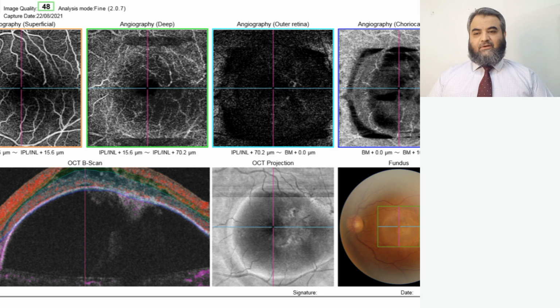Inferiorly, you can see the fundus photograph, and the left side lower is definitely the pigment epithelial detachment and over it fluids in the retina. And the thing I want you to concentrate on, please, is that in pigment epithelial detachment, under it, the space, there is moderate hyperreflectivity. Moderate hyperreflectivity. This is a very important point which we'll discuss in the later slides.